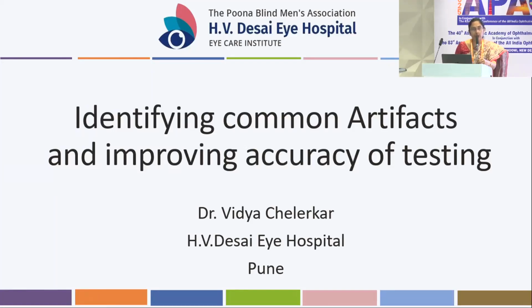Why it is important to identify the artifacts is that because these mimic glaucomatous field defects, they may be mistaken for actual glaucomatous defects, and they may also be wrongly taken when the patients have been monitoring, and then we assess progression in these patients. So identifying artifacts is very important.